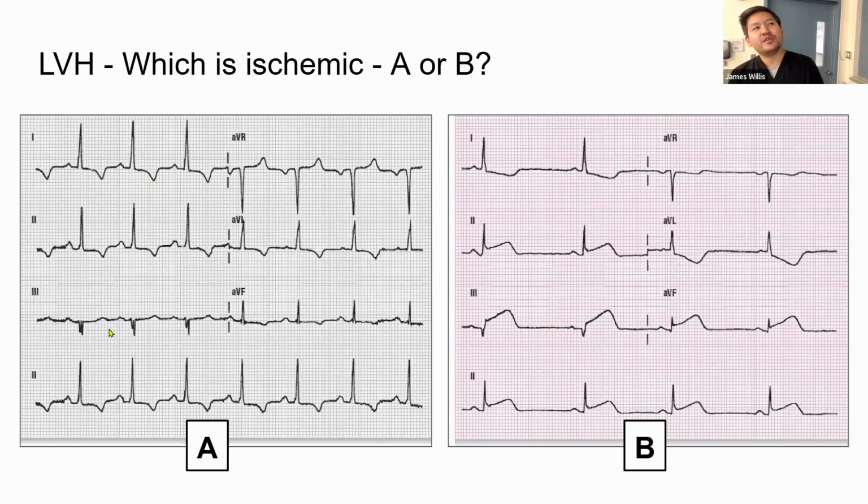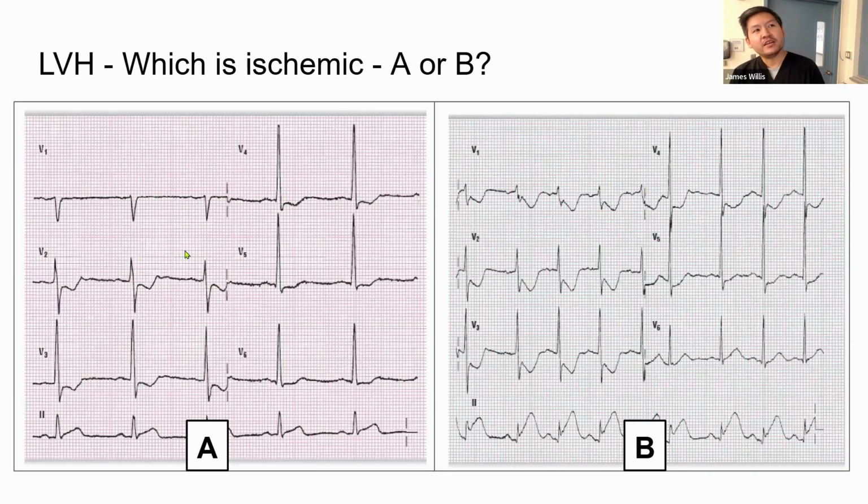Yeah, this to me looks very similar. It kind of fits the LVH pattern. What about here? A or B or both? So B, some people say B.